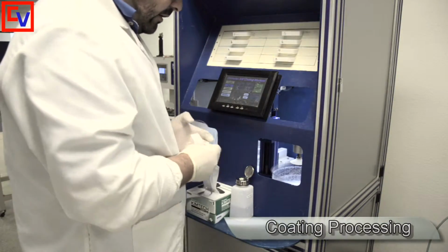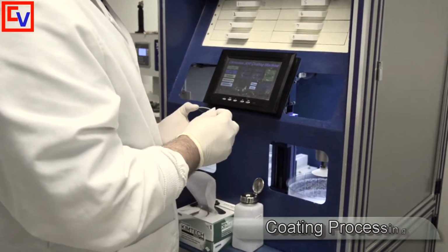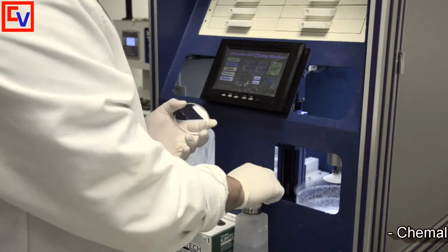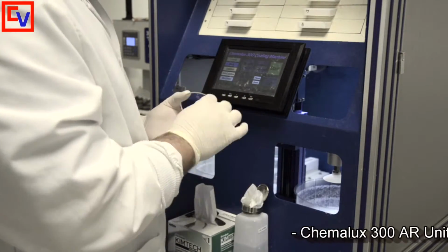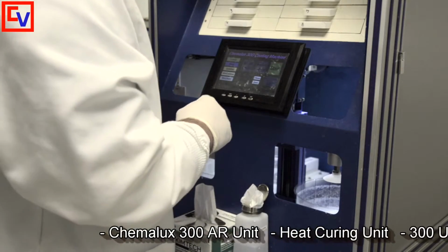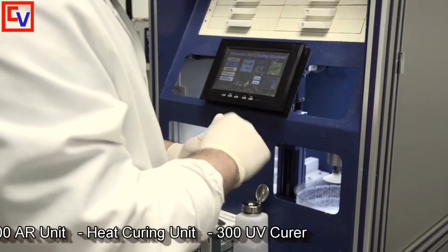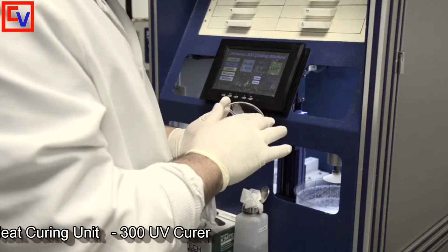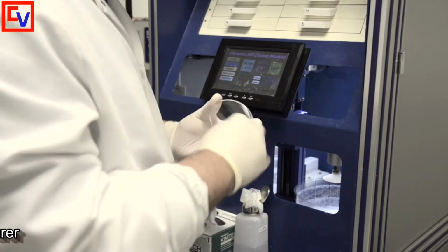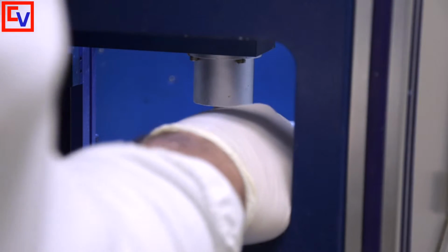So once you're ready to AR your lenses, you clean the lenses, the side that you're gonna AR with alcohol. Make sure you clean it very good, and then you can dry it, and then you load them. Make sure you clean them, both of them. The side that you're gonna AR only. And then you load the lens.